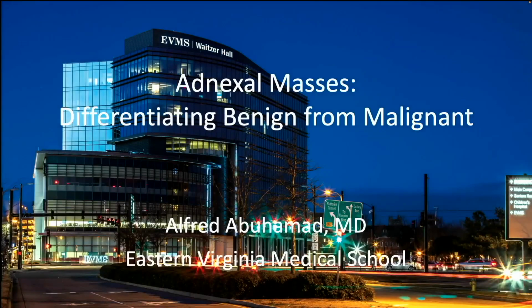During this presentation, I'm going to share with you some cases, and I assembled cases primarily in pregnancy, diagnosed in the first trimester, about adnexal masses, to give you some perspectives and some clues along the way of how do you evaluate those cases.